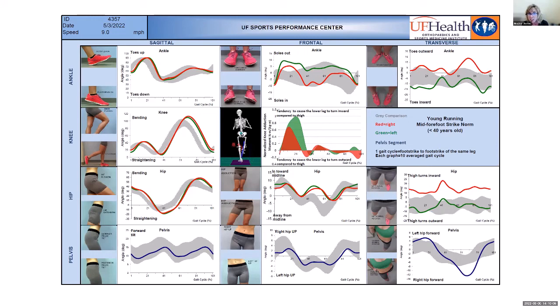The gray bars, the comparisons, are the expected motion that we might see from other healthy runners that don't have injury in the same comparative group. Now, if there's a speed differential between these, we understand, and there's context when we do interpretations here. So what I really use this for is symmetry and where we're really deviating. So very quickly, you can scan down.